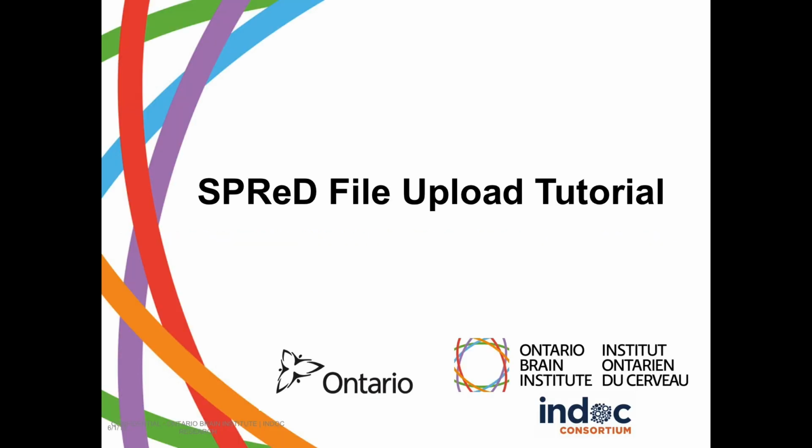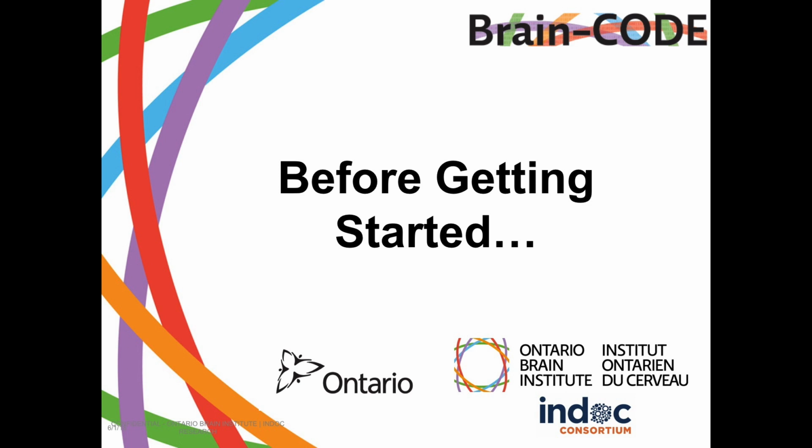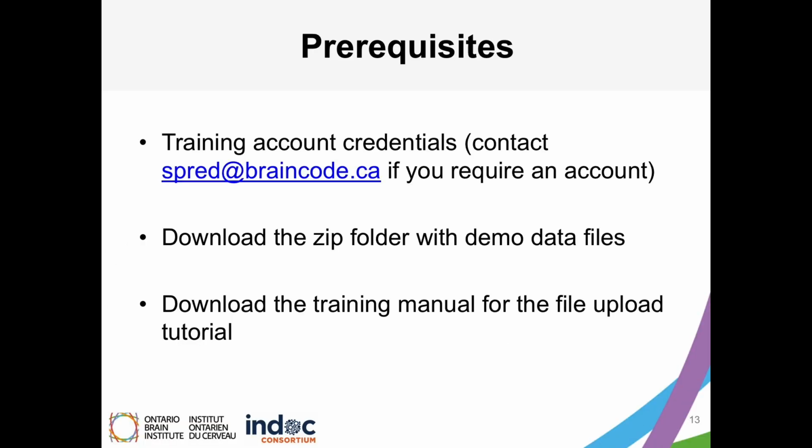SPReD file upload tutorial. Before getting started with today's training tutorial, ensure that you've been set up with a training site account on SPReD. If you do not have these credentials, email spred@braincode.ca for assistance. You will also require the necessary tutorial files to complete the file upload. Download the zip folder with the demo data files available in this module. If you encounter any issues downloading the zip folder, reach out to a SPReD administrator. The files will be needed to complete today's training. The training manual is available within this module in a PDF version.